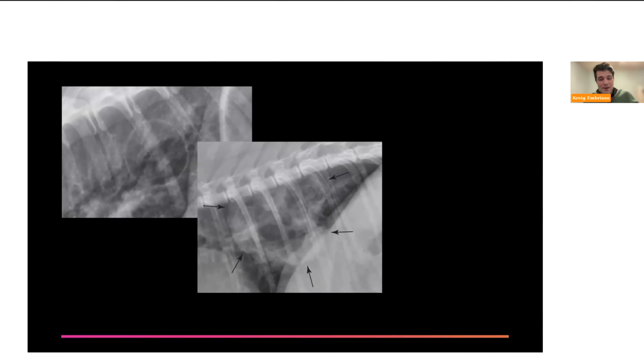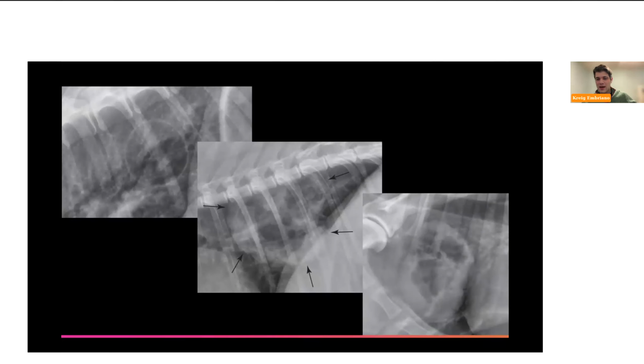This is a pulmonary mass in a cat, and so neoplasia would be the priority here. You can't rule out a granuloma or an abscess, so you can get fungal disease, or parasitism, or a sterile granuloma. But more often, as they get older and just in terms of commonality, neoplasia takes the top priority usually. And this is a similar lesion in a dog in the cranial lung field. Again, very variably thickened walls, irregular gas cavitations. Neoplasia, granuloma, and abscess are going to be prioritized, with unlikely things like a pneumatocele.